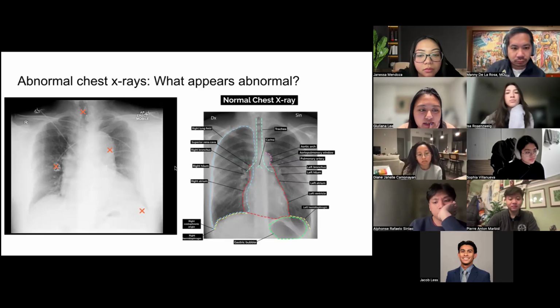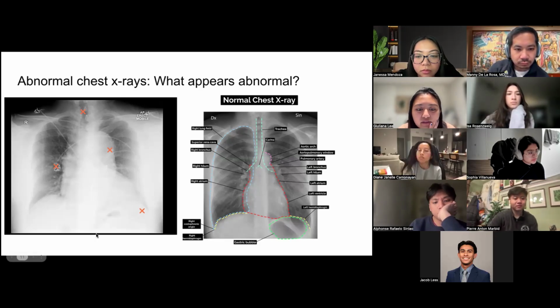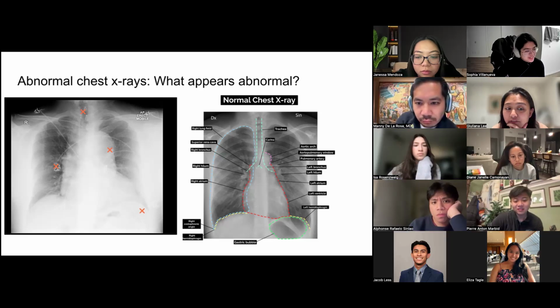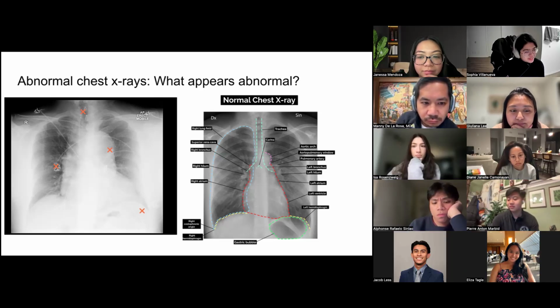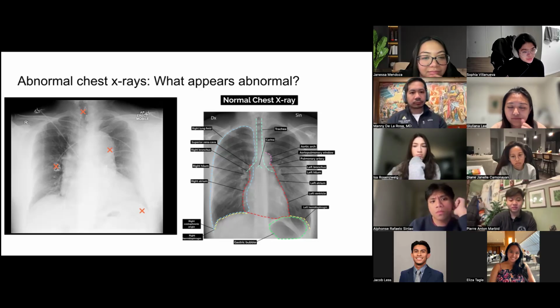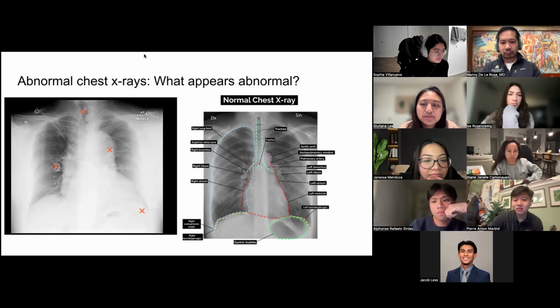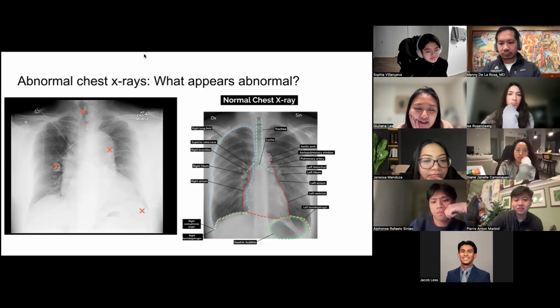Okay, I also see an X down near the left diaphragm. What is someone seeing down there? You can barely see the diaphragm. And if anything, the whole image is pretty white. So I'm not sure what that's more indicative of, like a pleural effusion or edema. Fantastic, what a wonderful thought.